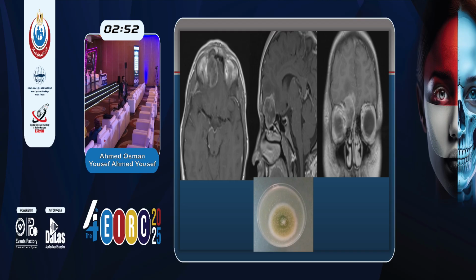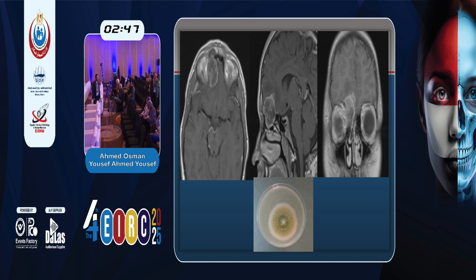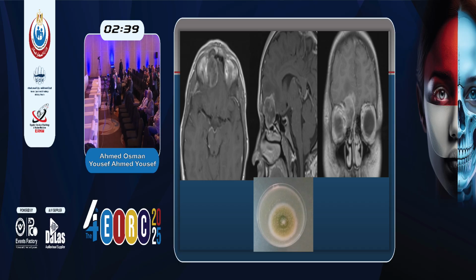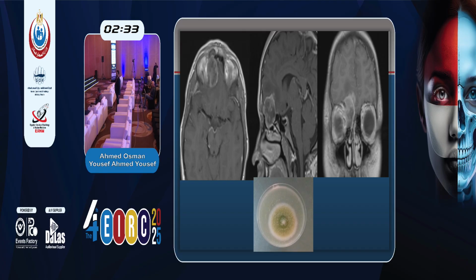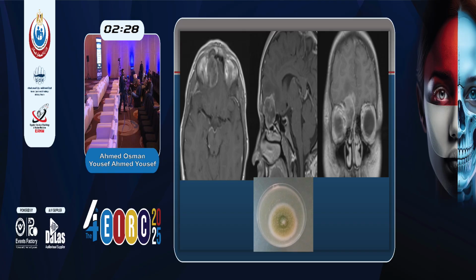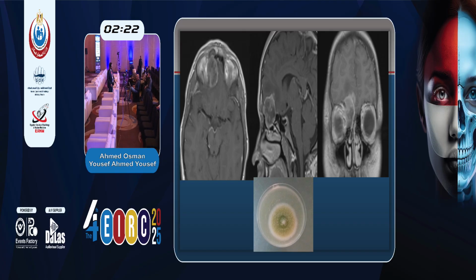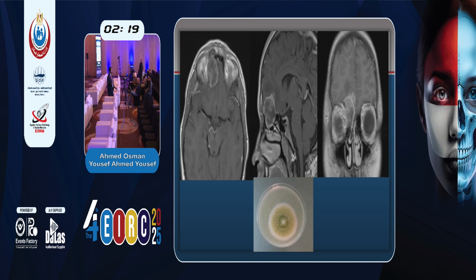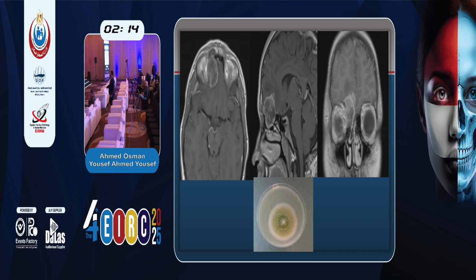This is the same patient. So your order of differential diagnosis will be first, fungal infection. Second, lymphoma, of course. It can also infiltrate the sinuses and show intracranial extension. I think bronchogenic will be remote, because it is not metastasized intra-axial, not a sinus with intraorbital extension. So this will be a very remote possibility.